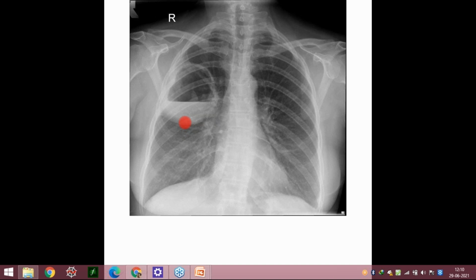And if you go by the size, if let's suppose the size of the cavity was a smaller one, you can still expect that the tumor is there and there may be a cavity inside, but it is again a rare possibility. Wegener's with secondary infection will have multiple cavities. A single cavitatory lesion in Wegener's is very, very rare. And ABPA will not be like this. ABPA is different. Okay, so these are the common differentials that you should be aware of. One is abscess, one is tubercular cavity, one is pneumatocele. Okay, so these are the things that you have to remember.